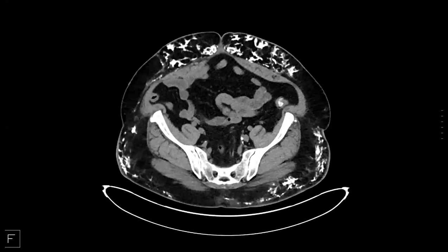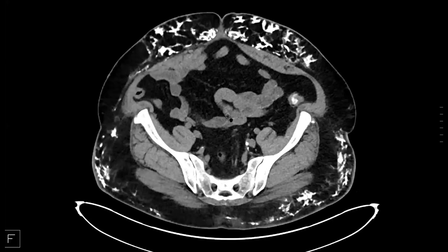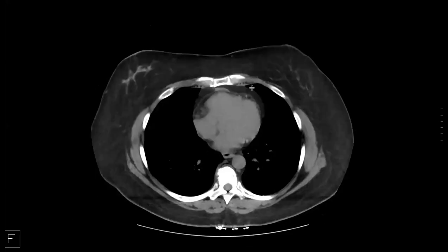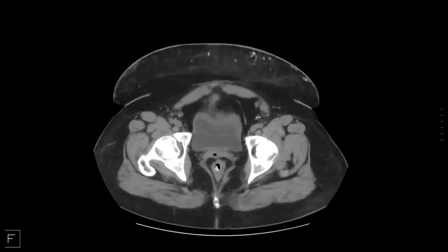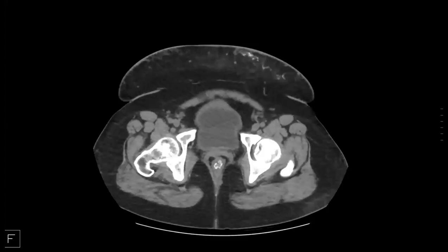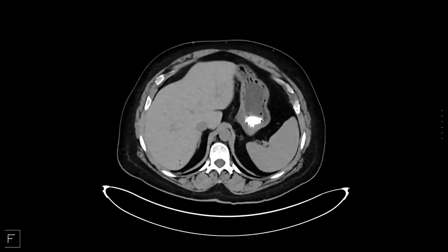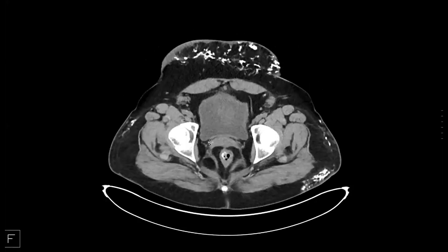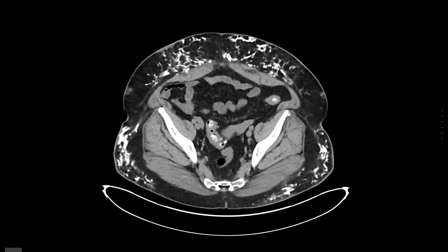This is a patient who has end-stage renal disease and is getting a pre-renal transplant CT. They had a CT 3, 4 years prior, and all the soft subcutaneous tissue findings were, I guess, a little bit there, but have certainly progressed over a course of 3, 4 years. Any thoughts on what you think this could be? I have two differentials. Uremic arteriopathy versus calciphylaxis.